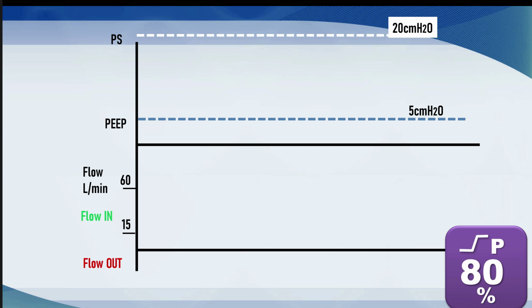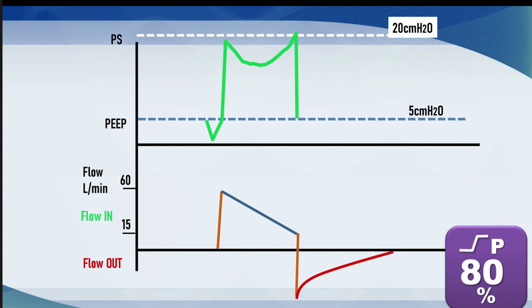In this scenario, the driving pressure is 15 centimeters of water above PEEP, and the rise time is set to 80%. There is a big inspiratory divot that almost reaches atmospheric pressure, followed by the inspiratory waveform. You will notice that we don't have that nice flat top pressure limited waveform that we are familiar with, but a droopy scooped out picture, eerily reminiscent of the one I showed you in the tutorial on volume assist control. And this is the same thing, it's demand flow dyssynchrony.